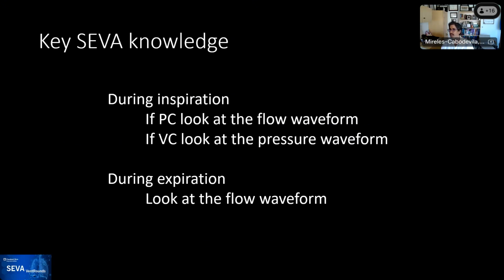And I thought that sometimes it is just going back to basic principles. I would ask you to recognize that when you're looking at waveforms for mechanical ventilation during inspiration, if you're in a PC, pressure control as a breath control variable, look at the flow waveform during inspiration.